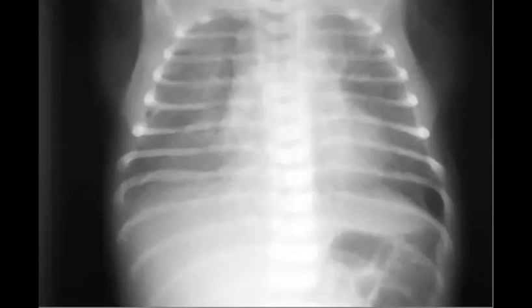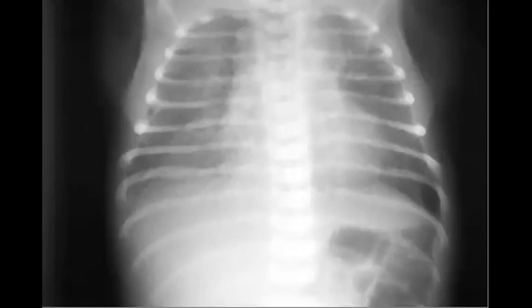So let's start pediatric imaging with the chest part. Maybe a few cases from the chest, then we can shift. Pediatric is more frequent in the exam, you will have some cases, and for the FRCR they also like it because you should be safe for the pediatric age group. So what do you think about this chest X-ray of a skeletally immature patient? How can you approach this case?